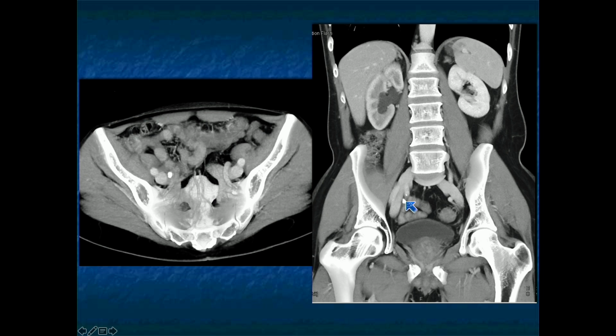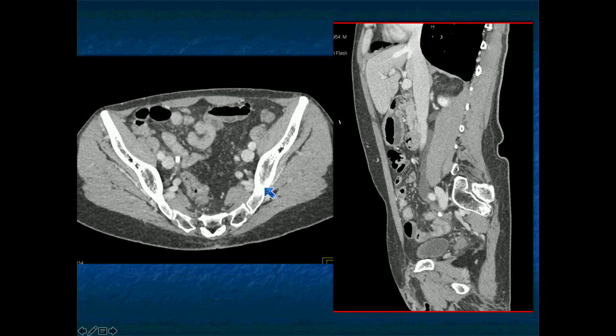So sometimes I do like looking at the coronals. I think one of the things that also helps, the urologists often want to know precisely where the stone is, L4, L5, S1. It's easier to define very specifically, and also often the urologist will follow the patients, and you would like them not to follow with a CT, so they'll follow with plain film, so you really create a plain film equivalent to look for any changes.